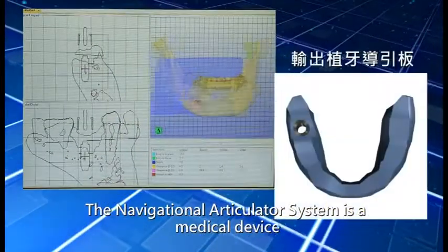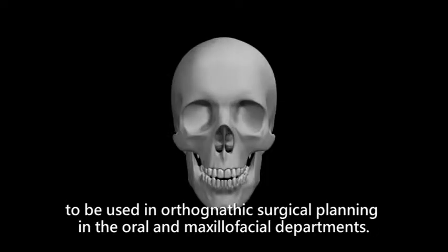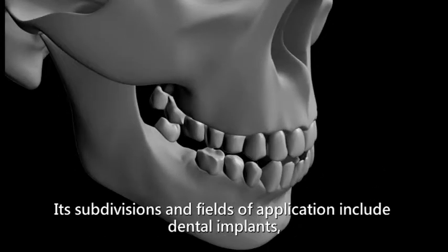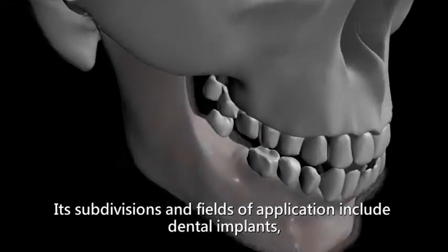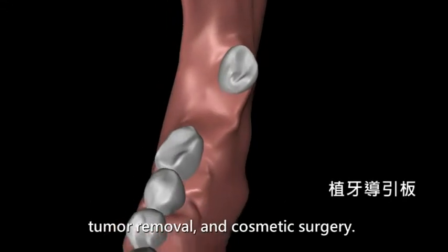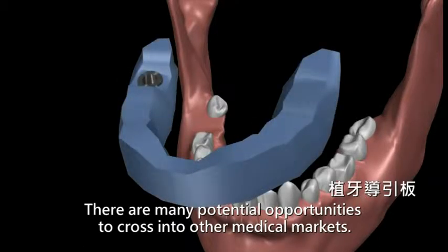The Navigational Articulator System is a medical device to be used in orthognathic surgical planning in the oral and maxillofacial departments. Its subdivisions and fields of application include dental implants, tumor removal, and cosmetic surgery. There are many potential opportunities to cross into other medical markets.